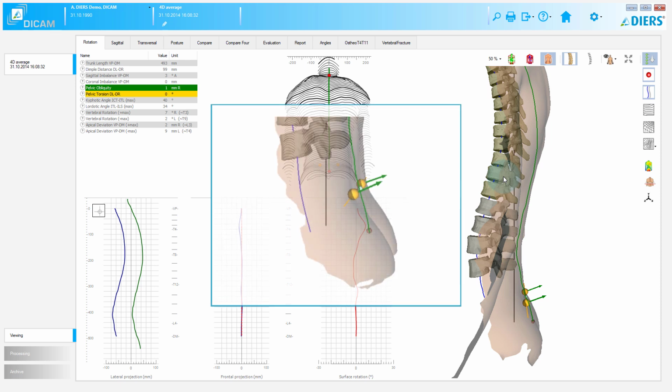A pelvic torsion with the side indication left would mean that the arrow in the L is steeper than the one in the R. However, it cannot be concluded from the value whether this is then associated with an anterior left innominate or a posterior right one.